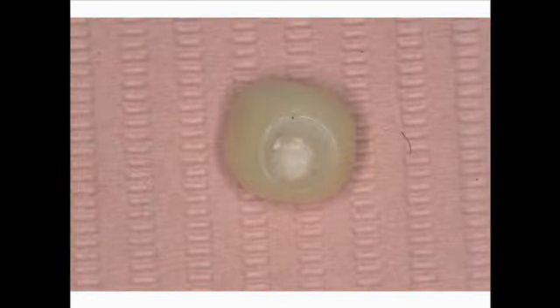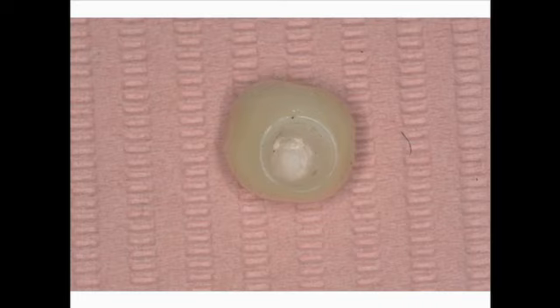Different designs and types of crowns can be fabricated by the dental laboratory, including aesthetic and durable zirconia crowns, conventional porcelain fused to metal crowns, or crowns intended to be used for bruxers, like the bruxer solid zirconia materials. In this situation, it was determined that the zirconia crown was the most aesthetic and would be the most durable. The translucency appears to be the best of the three choices that I just gave you.